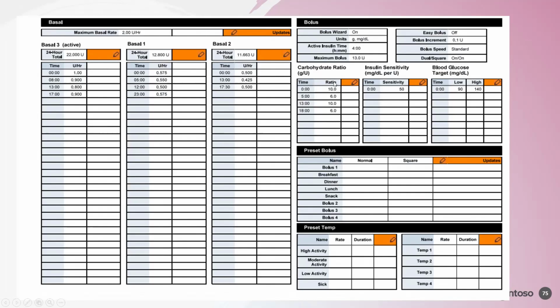And this is the carb ratio he set for carbs. Still in the Medtronic 780, we said we can insert a carb segment according to our desire. We can make many segments of carbs, and then the pump will do the bolus correction for us. And the correction sensitivity is there.